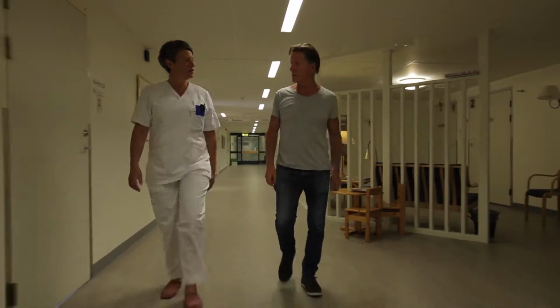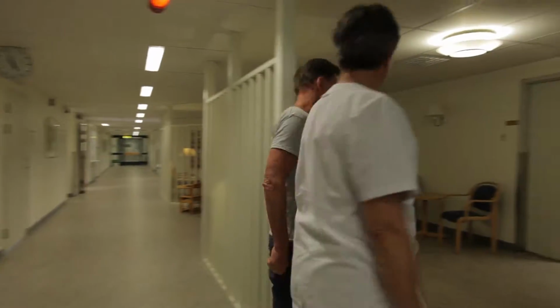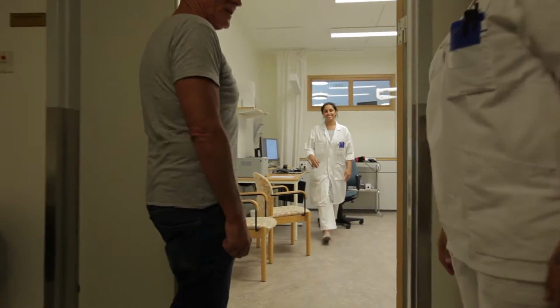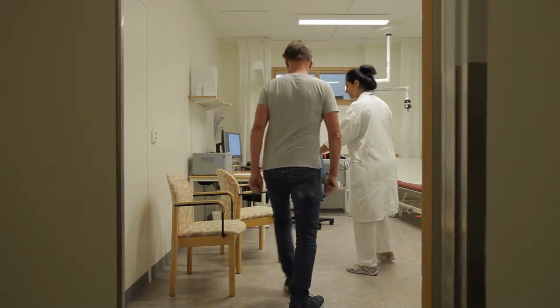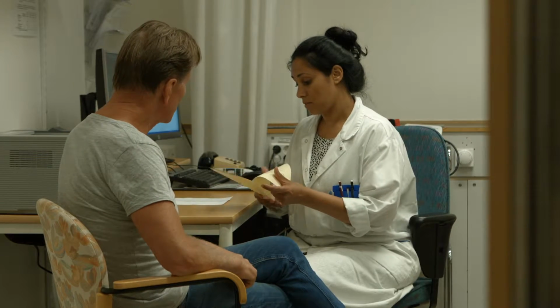Patient arrives to hospital to talk with the oncologist about the coming treatment. The conversation takes place with the supervising radiotherapy doctor. To this meeting, you can of course bring a friend or a relative. The physician explains all the steps of the process, and you have the opportunity to ask detailed questions at this time.